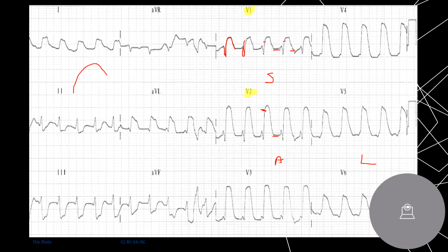So what I'm saying is, if you look at the heart here, all right, let's break it down. Because the left main comes out and then it breaks off into the circumflex and then goes into the LAD, the left anterior descending, right? If I say it's in the left coronary artery, that means it's all the way up here, which means it's infarcting literally over 50%, okay, which makes this what they call a widowmaker.